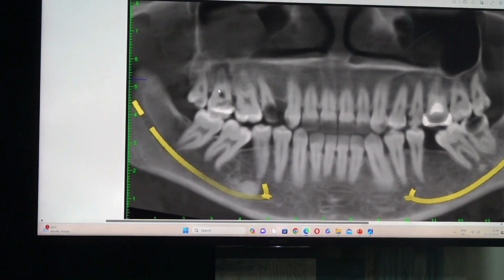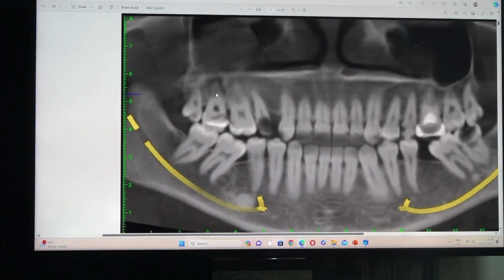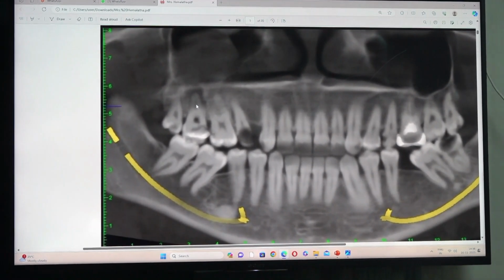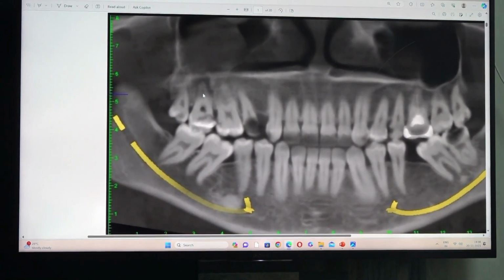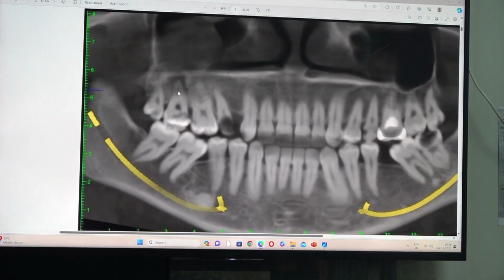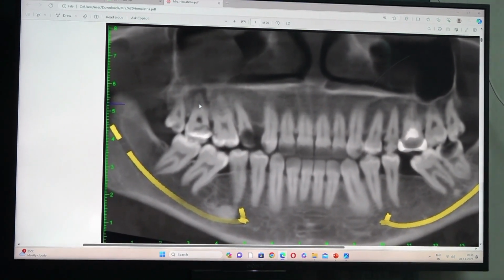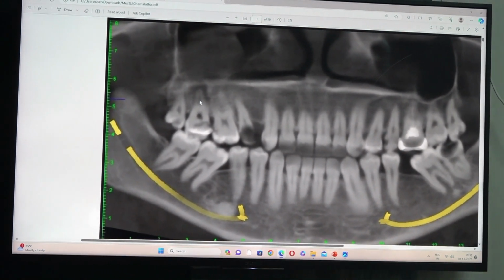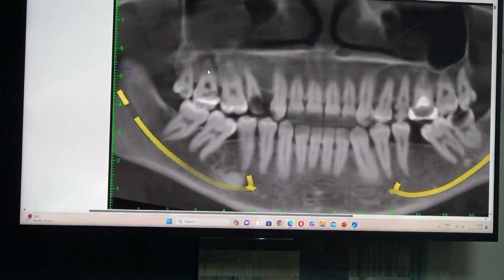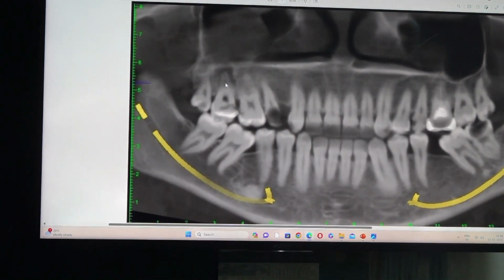And then the third implant, we can try placing in the palatal socket of 7. Of course, there is a lesion. We don't know whether there is good bone. We have to see the cross section, or after extraction you can check the palatal socket. We don't know whether the palatal root is present or whether it is conical with all roots fused. If all roots are fused, it is a disadvantage for us. The 8 looks like fused roots. That is not a good sign.